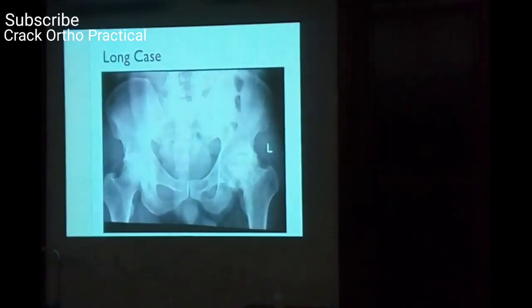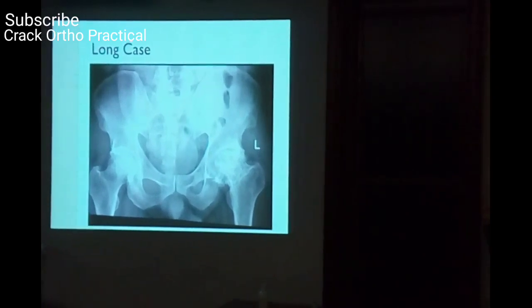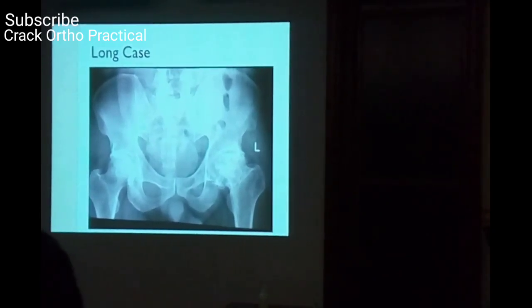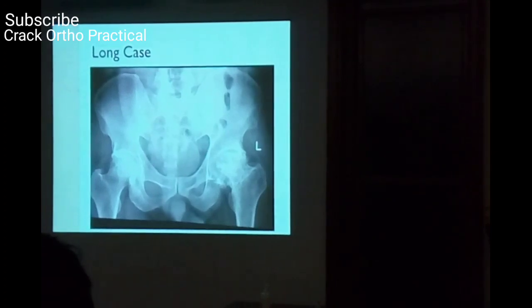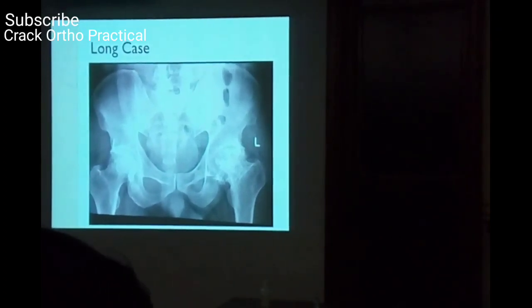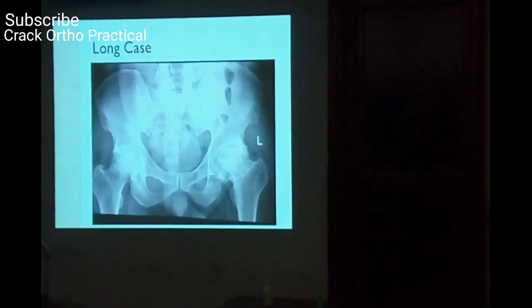Say, what next? So suppose you take an example of this, and we ask somebody to talk about it. Can somebody talk about it, taking all the previous headings? Can somebody describe this X-ray? Swapnil? Plain X-ray. Which view? Of?